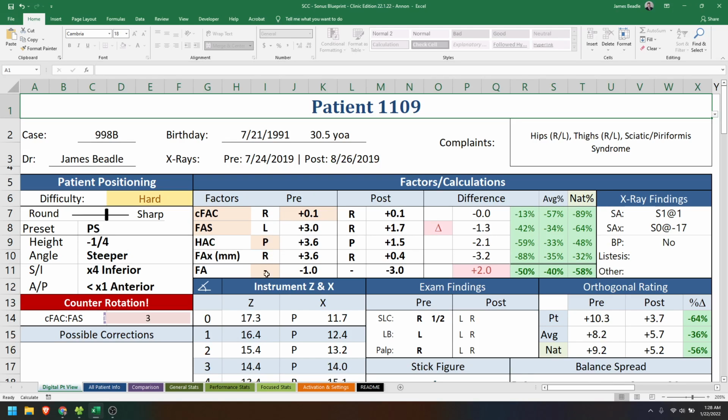Then if you see a highlight in this column, it's just saying that these are atypicals for the particular pattern that this patient has. So usually for contra, it should be anterior instead of posterior for the atlas, and that's why it's highlighting like that.